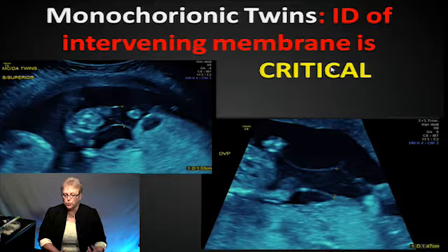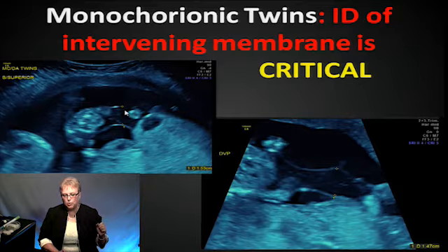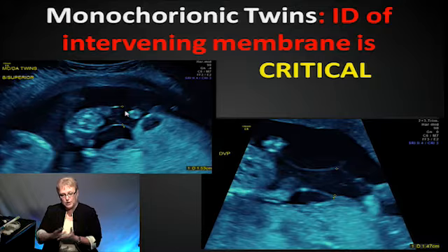And it's very important when you're looking at monochorionic twins, people will come along and say, oh, well, this is that baby's fluid and the other baby's was over there, that you really have to turn on the color or turn up your gains to see that membrane because sometimes it's really close to the baby, almost kind of saran wrapped around the baby.